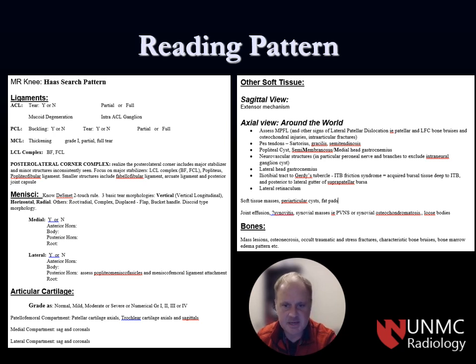This is a busy slide, but basically what I'm going to do is snip out the little sections that we're going to look at individually, and we'll go over both some normal anatomy and pathology to look at this further.